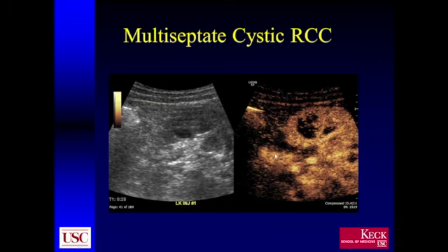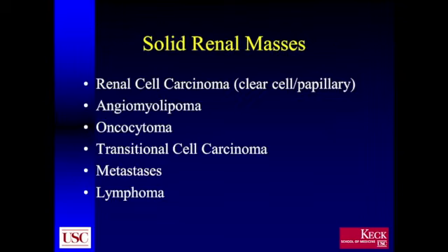And sometimes I'm finding myself a little more paranoid about just calling cysts based on the grayscale appearance alone, because a lot of times there is fill-in and background noise, but I don't think anyone would have a problem suspecting that this should be classified as a malignant lesion based on the enhancement pattern following contrast injection.